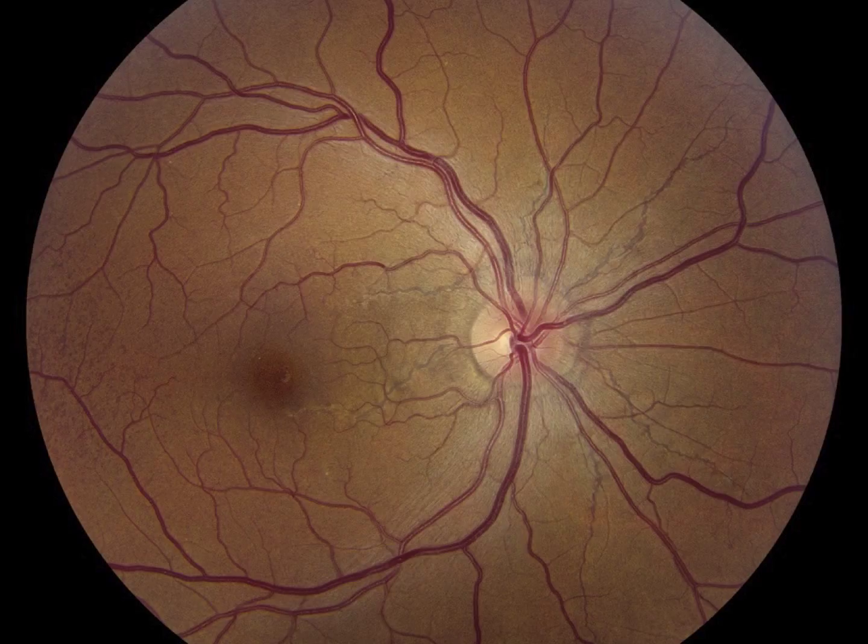And so looking at the disc, it looks relatively normal, maybe some temporal pallor, but rim thickness looks okay. Looking at the vessels, the contour and appearance looks normal. So the macula, it looks like there's some type of hypo, I don't know what you would call that, kind of hypocoloring, I don't know. All right, of the changing color, and you're talking about inferior to the fovea.